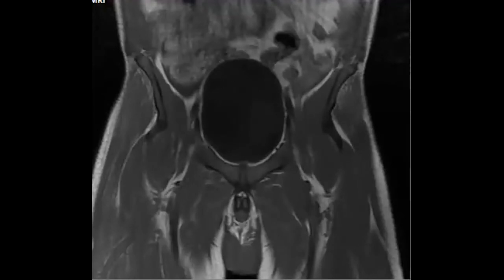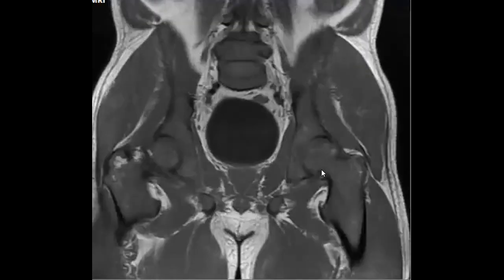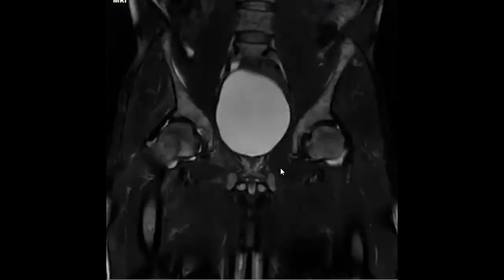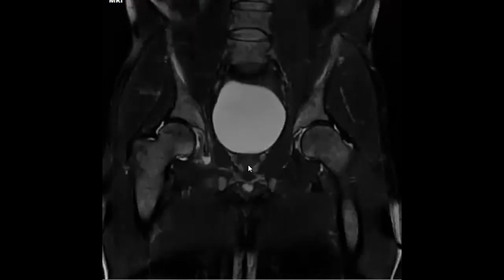He looks again like a young patient. You see the epiphysis. For advice, don't ask the examiner for the age. Try to characterize it yourself, because if you ask him, I think it may be a key for the examiner. So better to try to figure out how it could be. Some examiners are so sensitive in these topics. So yeah.